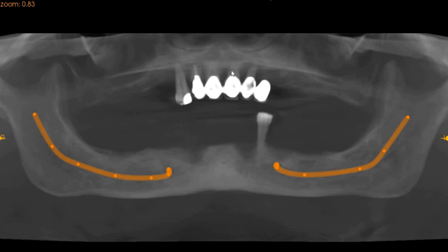Now, this is the CBCT of the patient that you had requested. The area of interest is the upper and the lower arch, and the kind doctor has requested implant placement options. Now, this patient has a canine on the upper right quadrant, has incisors in the upper anterior region.